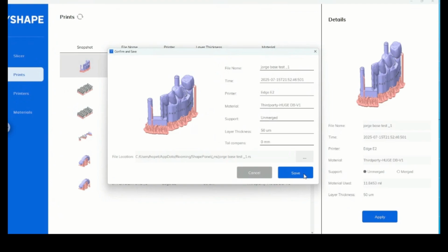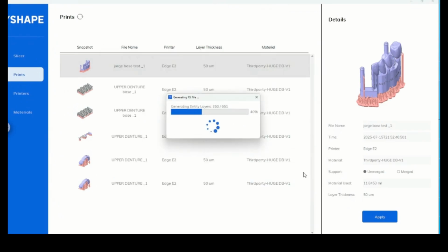At this point, the nesting software is also talking to your printer, and both will be allowed to make any changes. If you go back and re-upload it, it will be saved on your printer as many times as needed. Just note that once you go back, you will have to resend it if you change the name or anything.